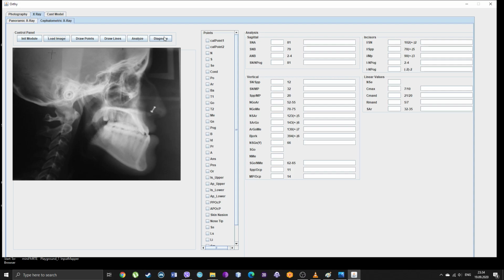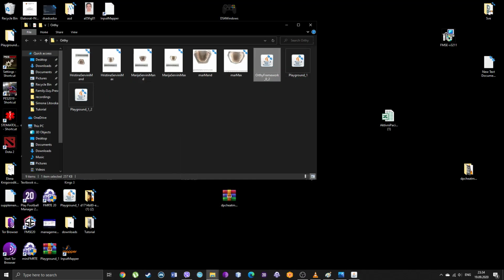After that, you do a print screen, save it to a paint program, whatever. Just save it somewhere and you have it, or you cannot save it if you don't like to. You just have the results here, and it is what it is. It's not perfect, but it's nice, it's useful. That's the short introduction of my program.